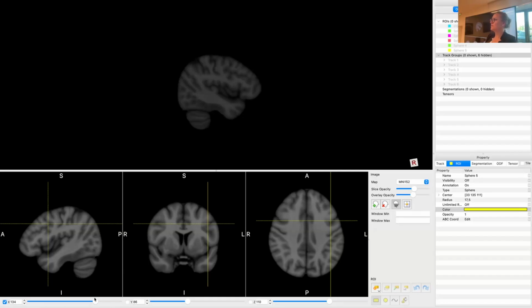What's the name? The stem, temporal stem. Temporal stem, yeah. Any other suggestions? Just the temporal stem and some exclusion zones behind. Okay. Now, all of these versions work. They all work. So you can use the one you prefer.